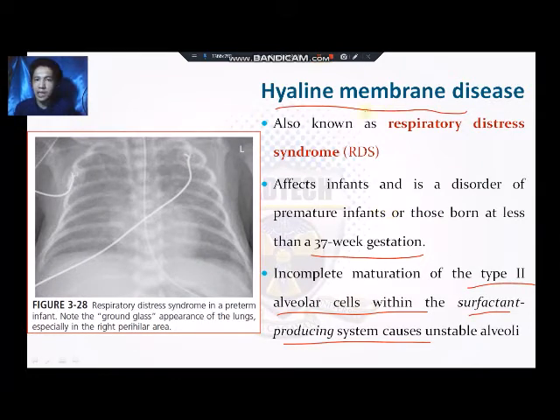Okay, so if ever na hyaline membrane disease atong patient, tapos ato silang x-rayhan, then this will be the appearance na siya. So again, the lungs are supposed to appear as black, no, radiolucent uta na sila. Okay, so black untay lang appearance na, but because of the condition of patient, as you can observe in this image, no, medyo na sila naa sa gray nga portion. Okay, so that means gamay ra kay nga hangin ang sulod ni sa iyahang lung field. So even if mga bata pa, even if mga newborn pa, x-rayhan nato sila, dapat itom gid unta na ang ilahang lungs because they are filled with air.